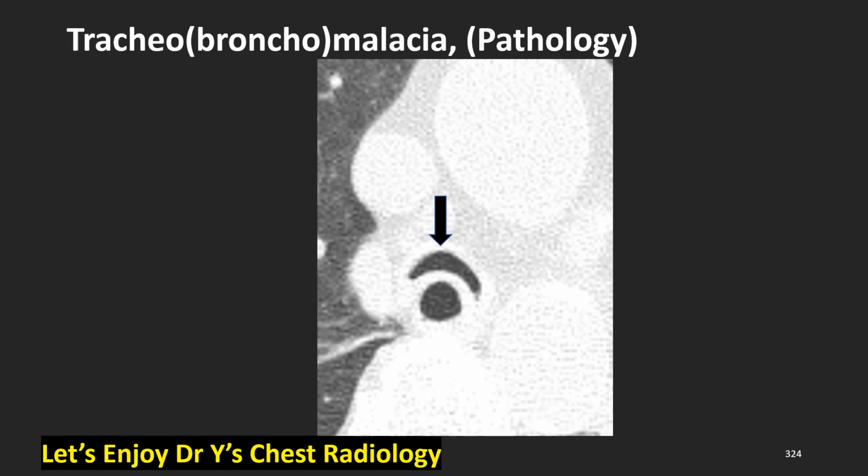Tracheobronchomalacia, pathology. Arrow indicates tracheomalacia.